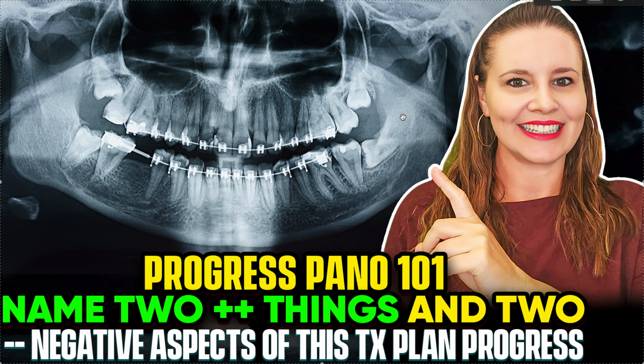Okay, so someone handed me this pano. I'm thinking, okay, obviously the patient is in braces. Patient is maybe in the latter stages of braces because this wire looks thick and not thin. This is just something you can tell over time. This is definitely a rectangular wire, not a round wire, which tells me we are further down in treatment.